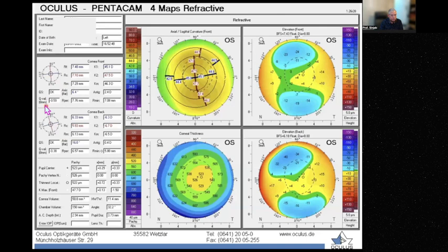Now, this is the Q values. It should be 6 millimeter here. Be sure that it is 6 millimeter. And I think it's 8 here, 8 millimeter. So this is not correct. Anyhow, the Q value does not necessarily represent the amount of spherical aberration because the spherical aberration correlates to the Q value and correlates to the radius of curvature. So 2 factors.